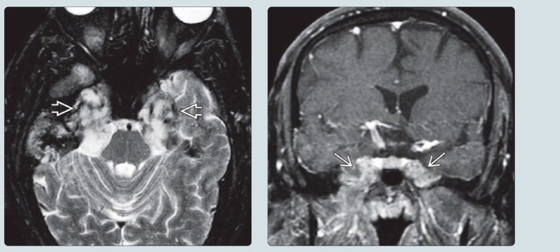without associated signal abnormality. On the right, that's the coronal sequence of the T1 contrast-enhanced MRI of the same patient, and it is revealing the enhancing globular masses involving the bilateral trigeminal ganglia, which are seen to be extending into the infrazygomatic masticator spaces via the widened foramen ovale. The internal auditory canals are not shown here, but the internal auditory canals in this patient were normal.